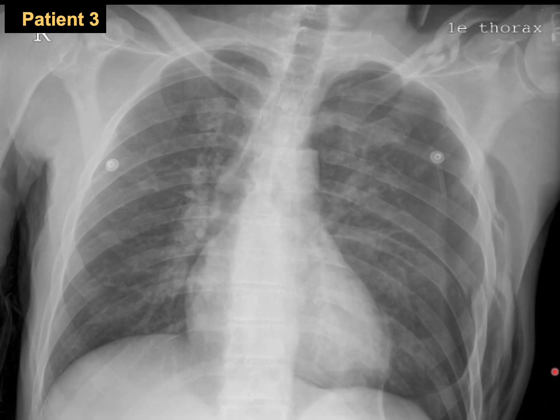Okay. Patient number 3, a 50 years old driver who hit an ambulance and reported left side chest pain and respiratory distress. Okay, don't be distracted by what takes your eyes here. Go systematically. This is the airway, and I think all of us can appreciate that it's pushed to the right side here. When you go to the B, breathing, you are going to start.